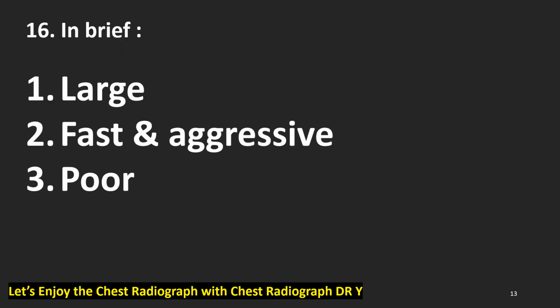We have reviewed 3 cases of large cell lung cancer: 2 cases showed solitary pulmonary nodule and 1 case a late-stage tumor. In brief, large cell lung cancer is large in cell size and also in mass size on the radiograph. Second, it grows fast and is aggressive. Third, the results are usually poor.